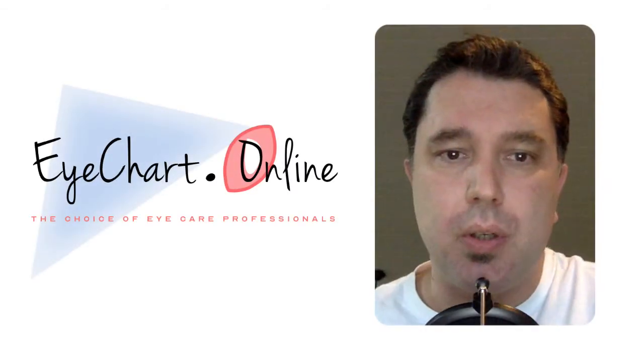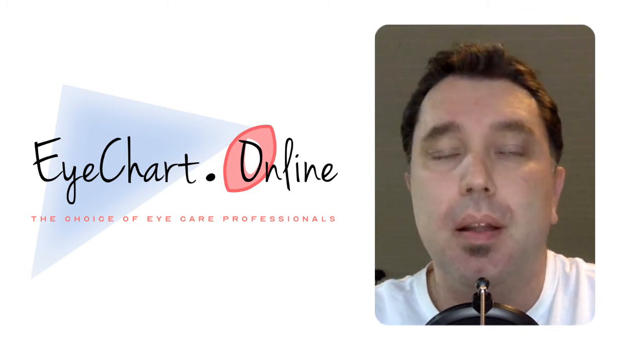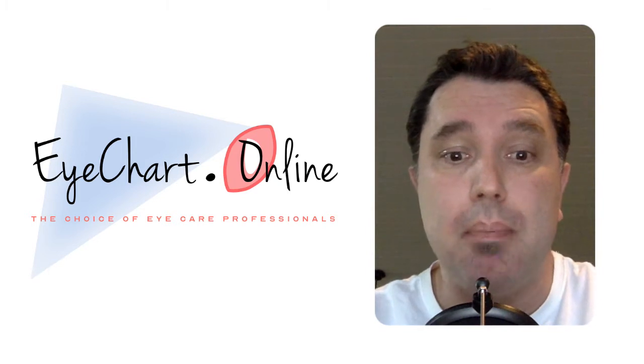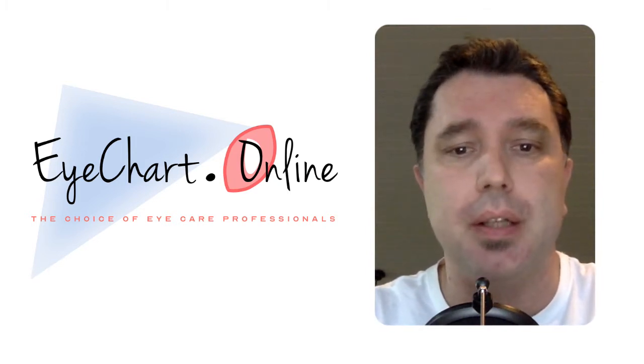We've tried to make Eyechart Online as user-friendly and intuitive as possible. There's basically three ways to control the chart. The first is with a mouse or an air mouse. Working with a mouse is super simple and self-evident.